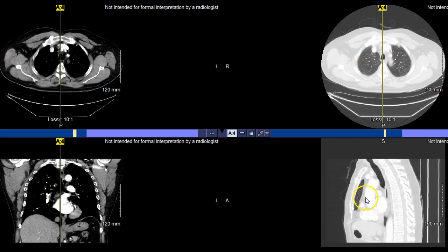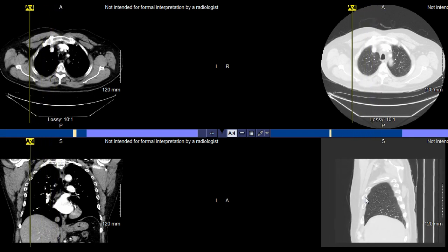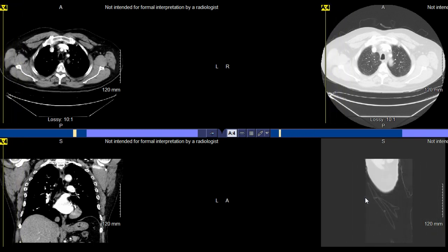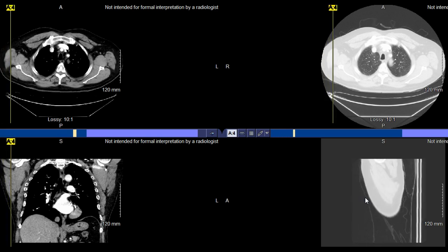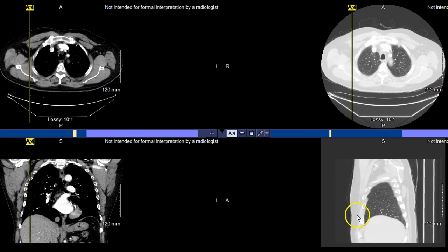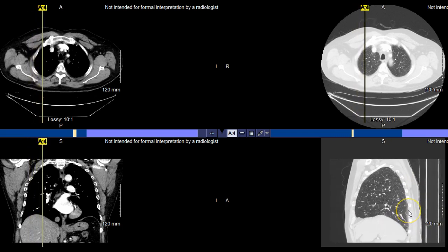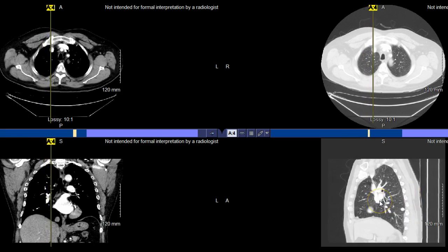And then correspondingly, I do want to go through the sagittal-based images as well. So just see from left to right what this is actually looking like. So go all the way to the outside here, and then work our way back in. So you can see the lungs, you can see the development of that. Here would be the anterior side, here would be the posterior side, as noted by those spinous-based areas and regions. Kind of see where we're at.